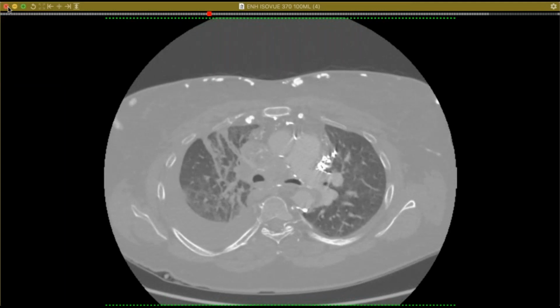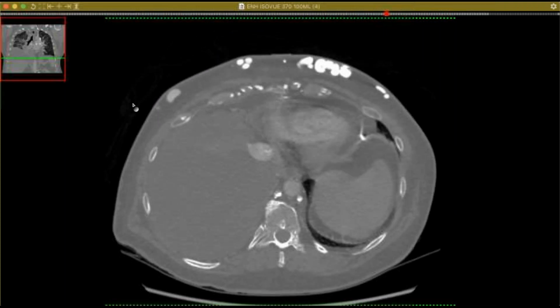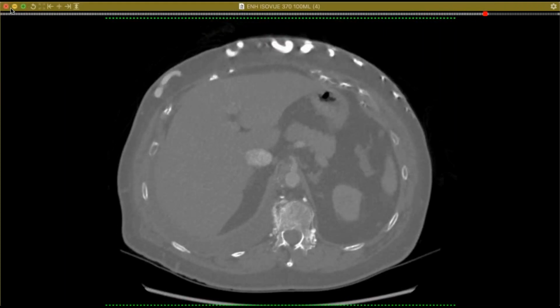Oh, how about the spleen? Do we have calcium in the spleen? Like histo? No, but it doesn't rule it out. Given it's a Midwestern patient, I'd bet on histo.